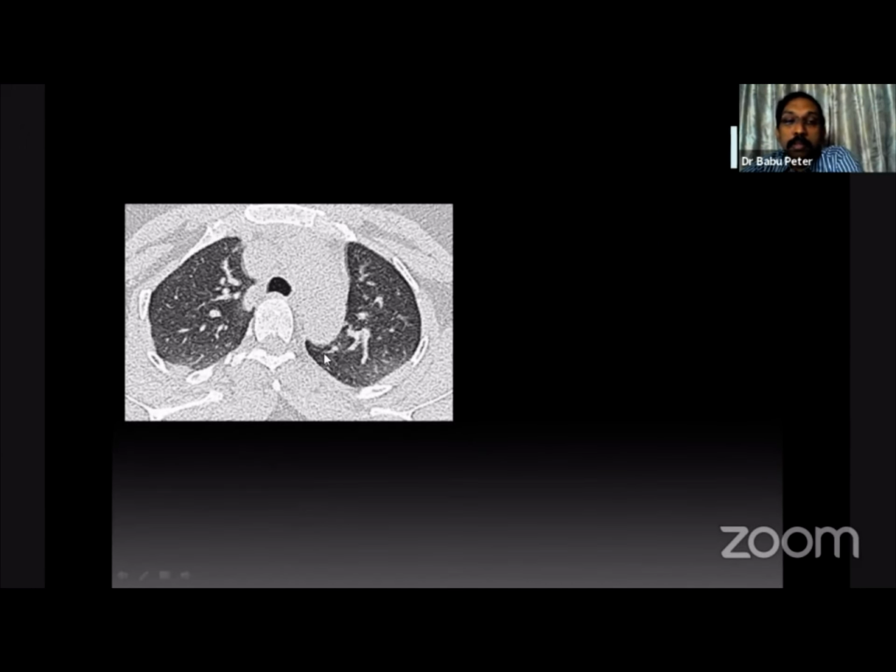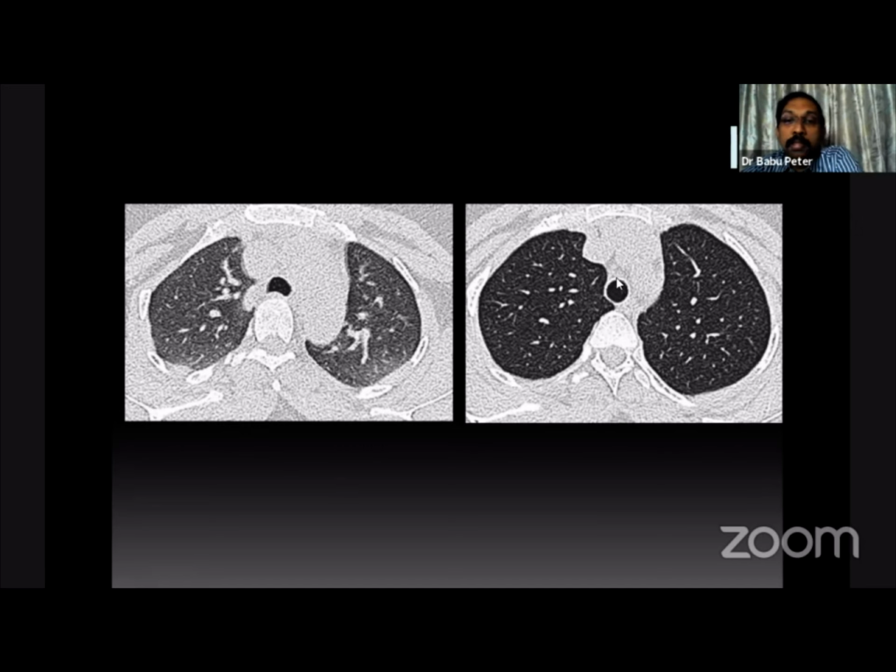The next important mistake that is made by beginners is this scan. You should not mistake this for a ground glass appearance. So this normal HRCT is taken in end inspiration. This is an end inspiratory scan where you see the normal lucency of the lung.